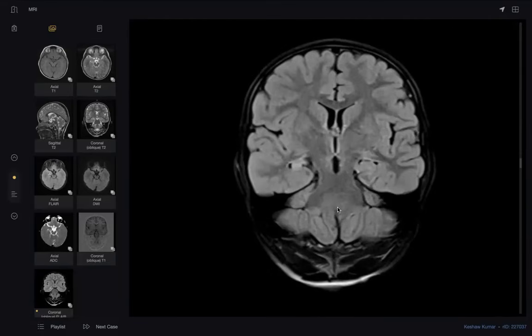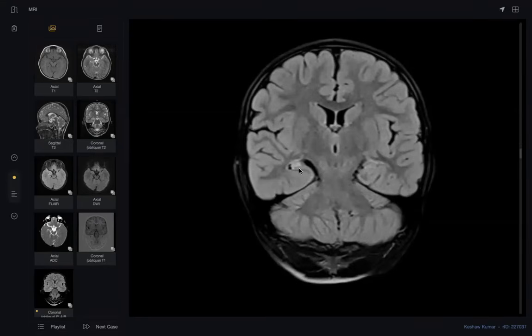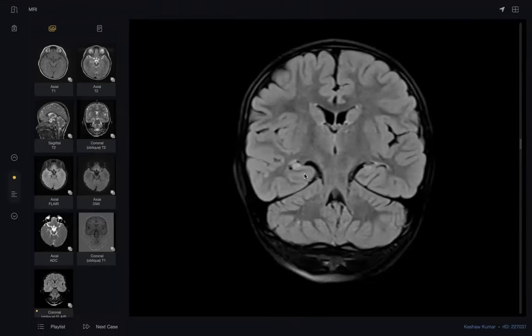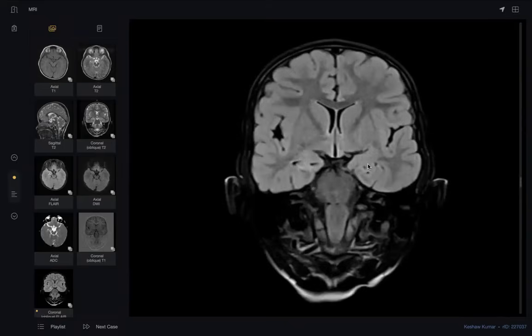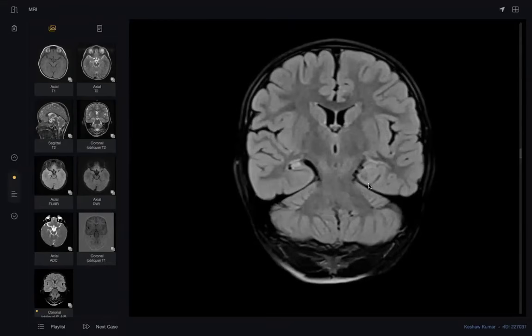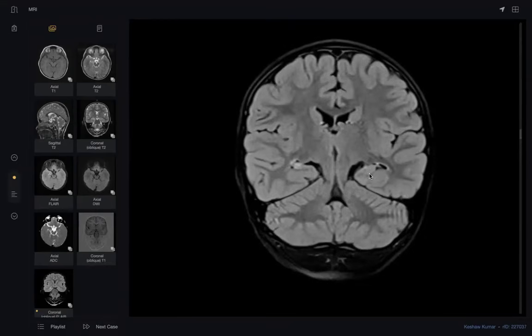Show me, please, I do not see by the mouse. Show me by the mouse. Where is the temporal sclerosis? This area as compared to this area? Or alternatively, if I retract my statement, this portion has become atrophic or reduced in volume. Where is the exact location of diagnosis of mesial temporal sclerosis?